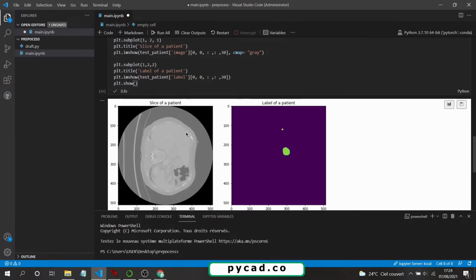We just loaded the image, added a channel, and converted it into a tensor. Now if you want to apply something, maybe we'll clear this white stuff that we don't need, which means we change the contrast of our image. And here now we will start doing the pre-process.